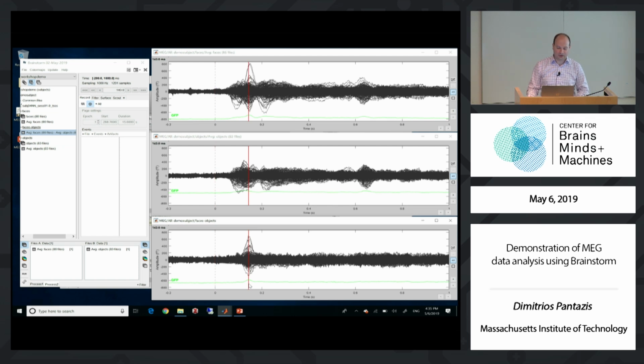So the brain visual cortex was able to dissociate faces from the remaining objects at around this time, which agrees with the times reported in seminal articles and the seminal work from Nancy Kanwisher, identifying the face responses at around this time between 130 and 170 milliseconds.